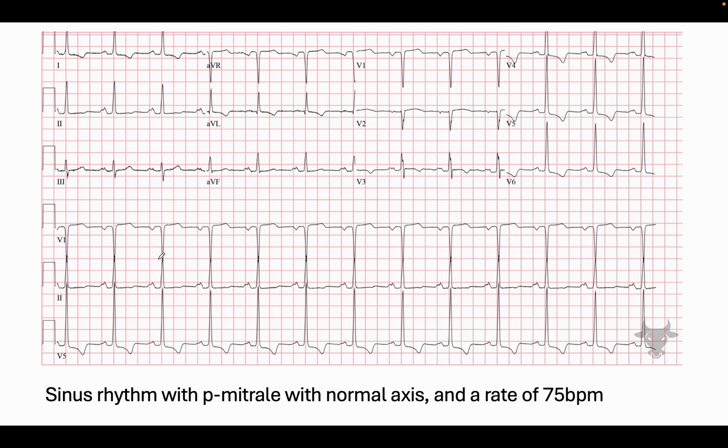So why is it sinus rhythm? Well, easily we can see P waves here, P waves there, followed by QRS. The T wave is a bit flat here, but we know there's a T wave because if we look at other leads, we can see the T wave clearly. So we know this is sinus rhythm. Now look at the QRS. Is it particularly broad? Not really. It measures just within 3 small boxes, so we know there's no underlying bundle branch block. So we don't need to comment on that.